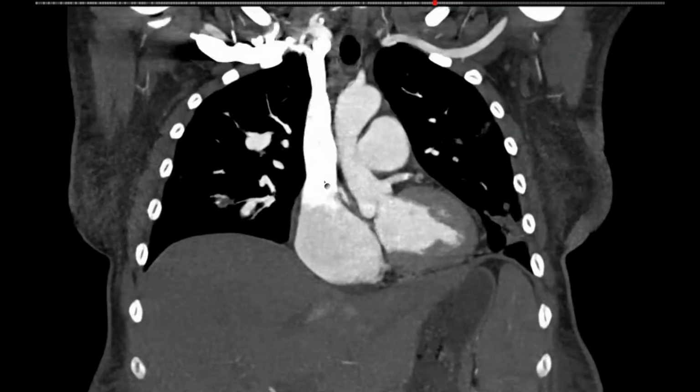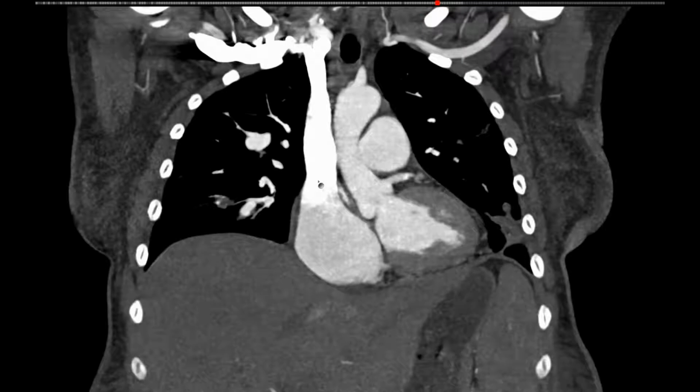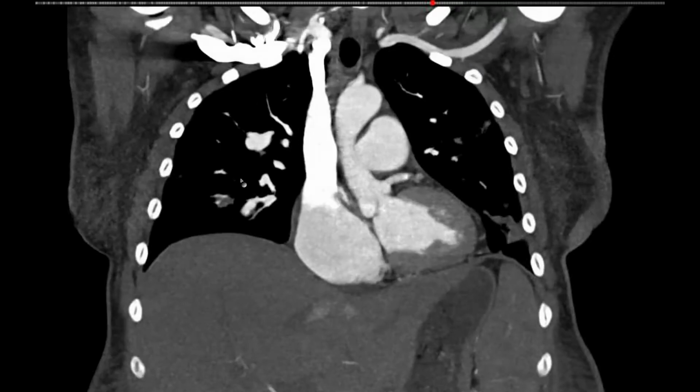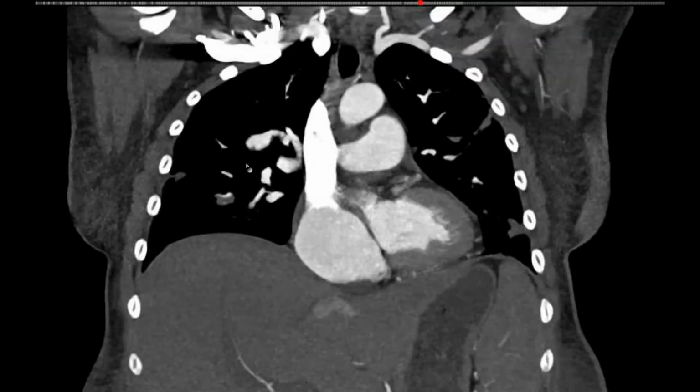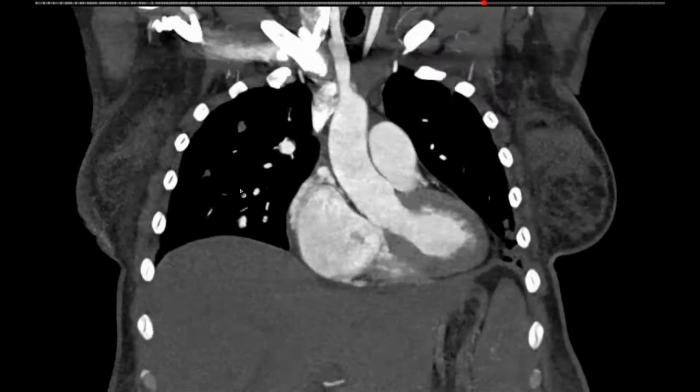So we have a lot of vascular abnormality, and I think in terms of your definition of pseudoaneurysm, if you require that even the adventitia be disrupted, well, this isn't that, but I imagine that people will use pseudoaneurysm to describe this, where you have maybe a paper-thin adventitia, but very abnormal vessels.